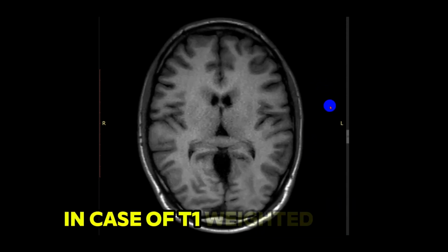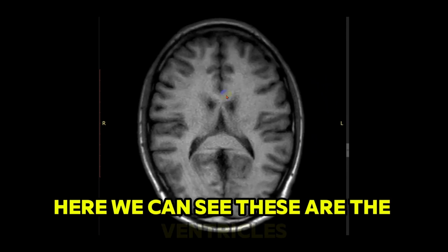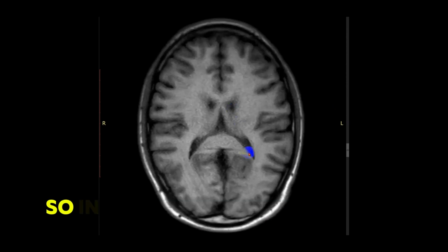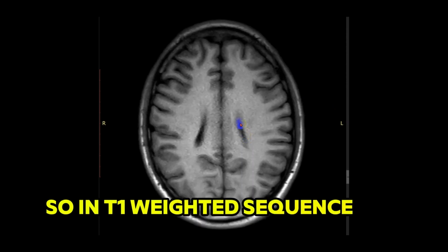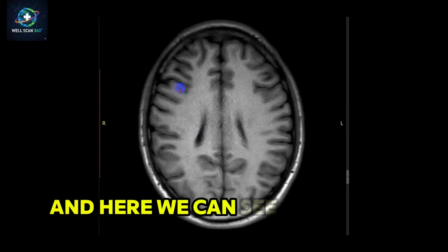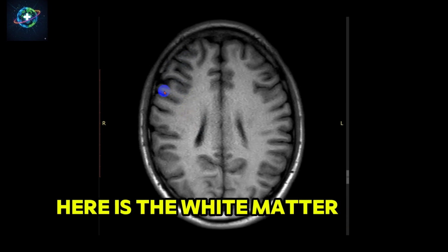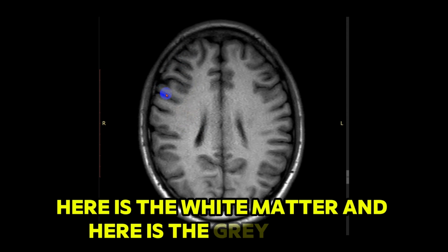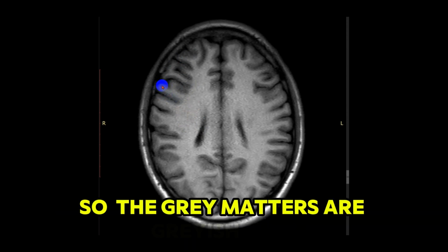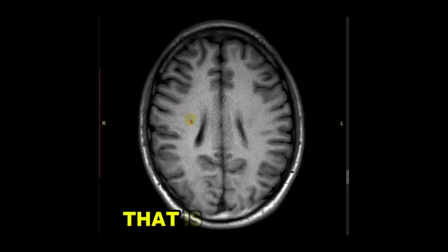In case of the T1-weighted image, here we can see these are the ventricles. Inside the ventricle there is fluid. So in the T1-weighted sequence, the fluids are black here. And here we can see this is the brain parenchyma. Here is the white matter and here is the gray matter. The gray matter is grayish here and the white matter is hyperintense, that is whitish.